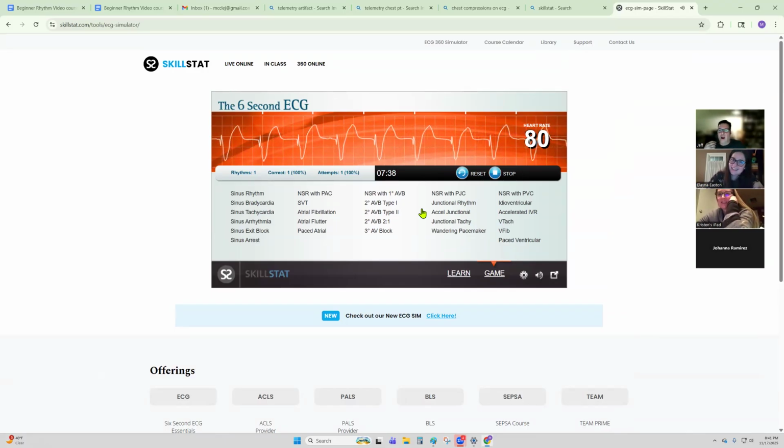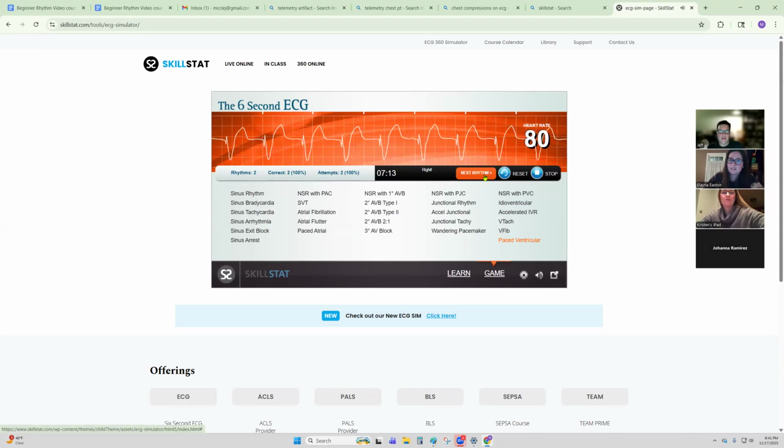Very regular. Heart rate's decently controlled, but the QRS is very wide, right? But then you have that little spike before the QRS complex. Does that have to do with the pacemakers? Yeah. Okay. Normally on a telemonitor, the pacer spike will be highlighted. So this is ventricularly paced, if I can say that. But it's that wide QRS complex, that little spot there.